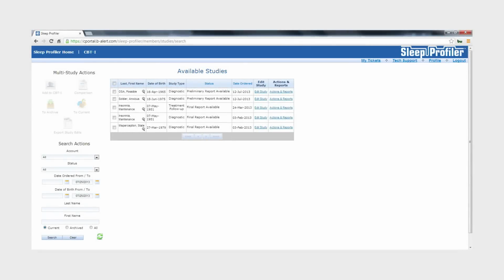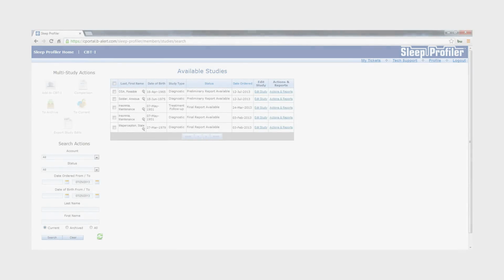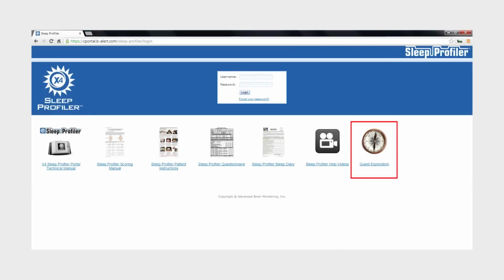This concludes the Sleep Profiler Portal Guest Exploration orientation. You can return and review any of these studies we have made available at your convenience.